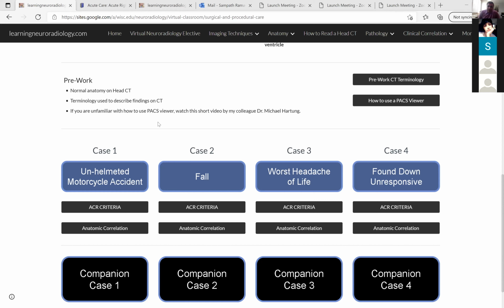So you have to put it in context. I can only call it hyperacute when I also see an acute hemorrhage. So you have to see what you're looking at. You say, well, I see some hyperdense blood, and I also see some hypodense blood, but since I see the hyperdense blood, it can't be old. It has to be something that's actually new. So you have to put it in context when you do that kind of image interpretation. I hope this answers your question.